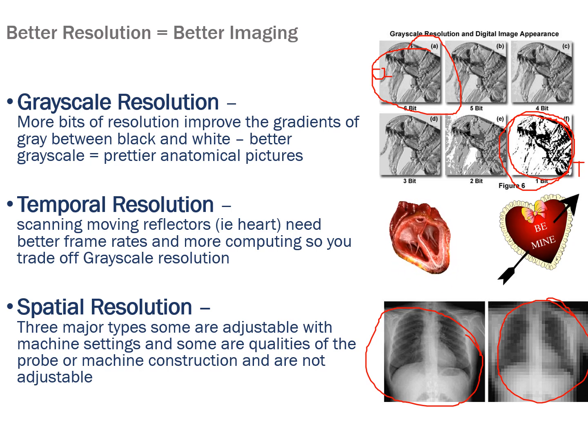And that largely comes with probe selection and machine manipulation. The handheld probes that we're using for this particular training session don't have many options for these changes. However, it's still an important principle because these can be changed based on operator performance, depth settings, and whether or not you're adding things like color flow or other forms of Doppler.